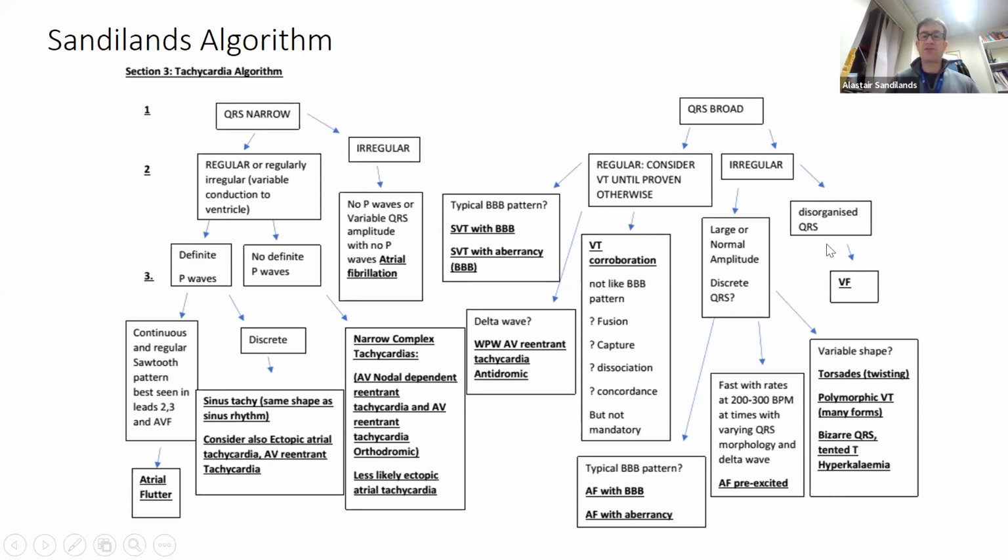Okay, so don't just forget this side, we're going to do that next week. So we're looking at QRS being narrow. Is the rhythm regular or irregular? Are there P waves? Are there any other features that tell you that it's these 3 things, sorry, 4 or 5 things? I'm going to have a look at that with some examples. Any questions about this?